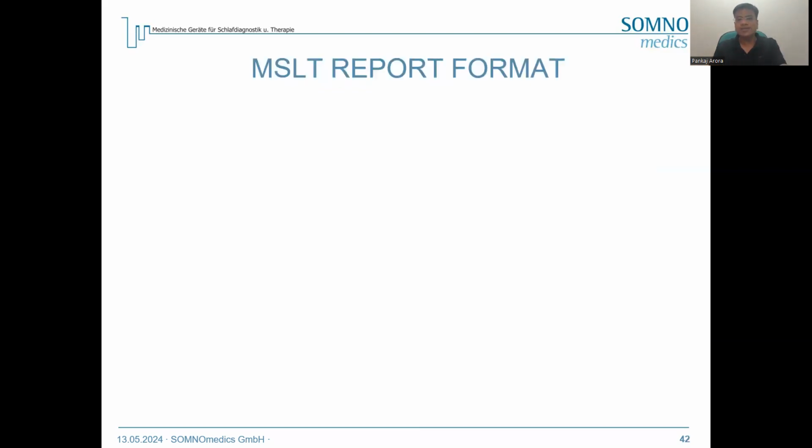You can also do the MSLT report. What is MSLT? MSLT is the multiple sleep latency test, which you do for the narcolepsy patient, for hypersomnolence, where the patients are feeling sleepy not because of obstructive sleep apnea but because of other issues like narcolepsy, cataplexy or idiopathic hypersomnia. So you need to confirm whether the patient has narcolepsy or not with the MSLT test.